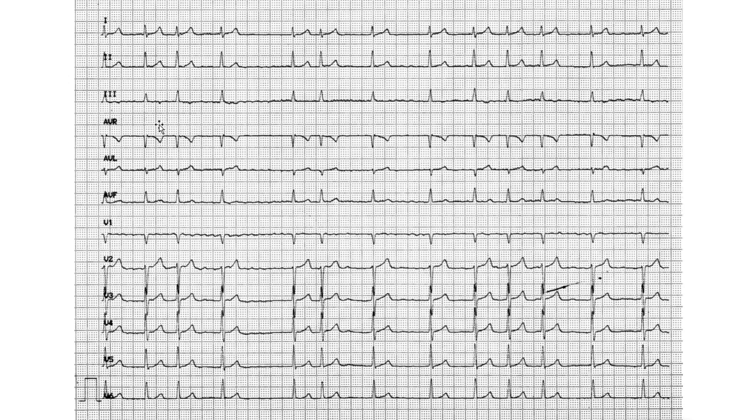So, example 18, we start off. Irregular, I'm just going to skip, it's totally irregular. There are no P waves, and there are jiggly lines over here and over here. This is clearly fibrillation. Point 1, that's point 2, non-sinus.